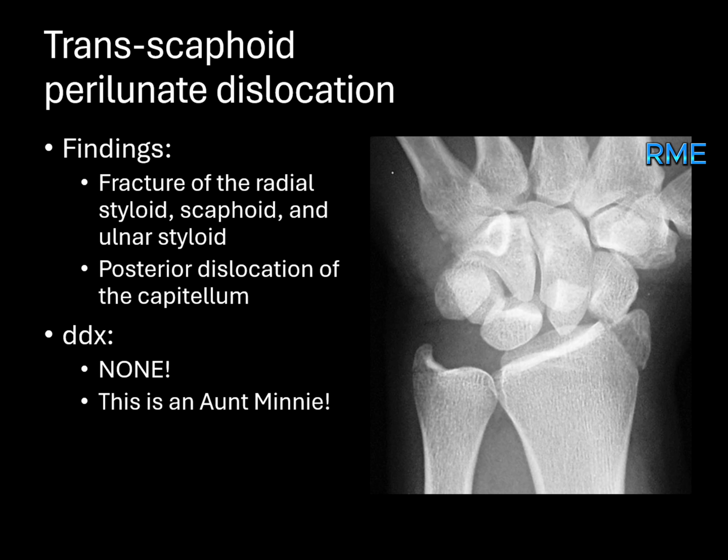To further evaluate, additional wrist views are helpful to assess the extent of injury. Management involves surgical fixation to stabilize the fractures and dislocation.